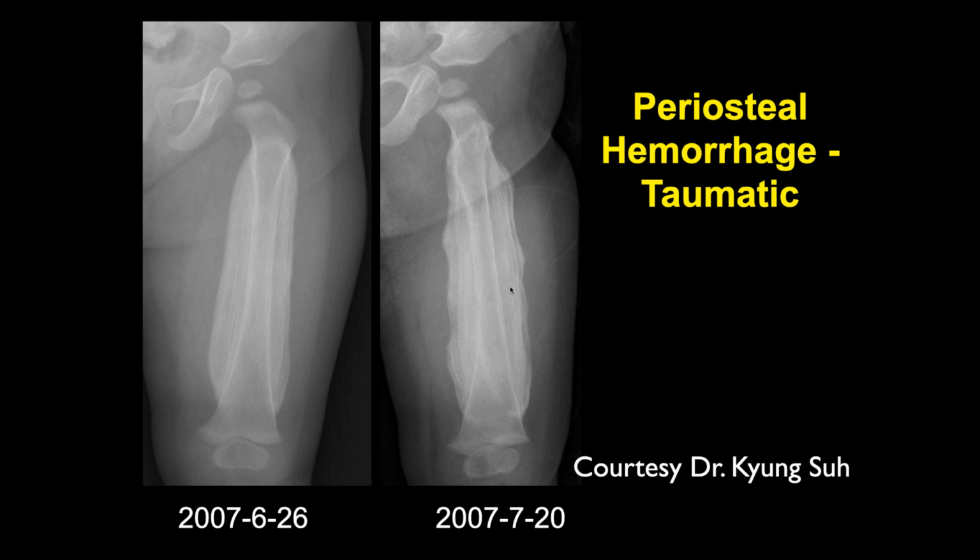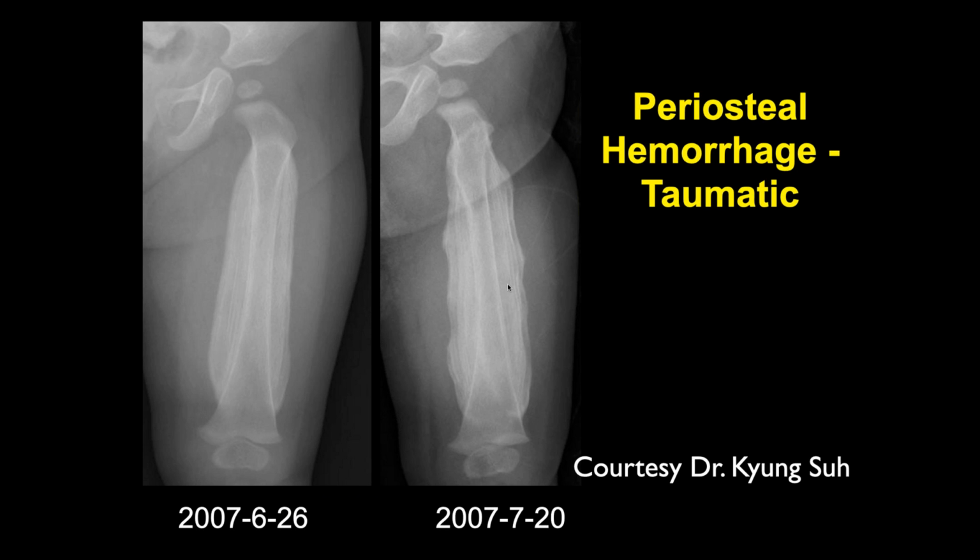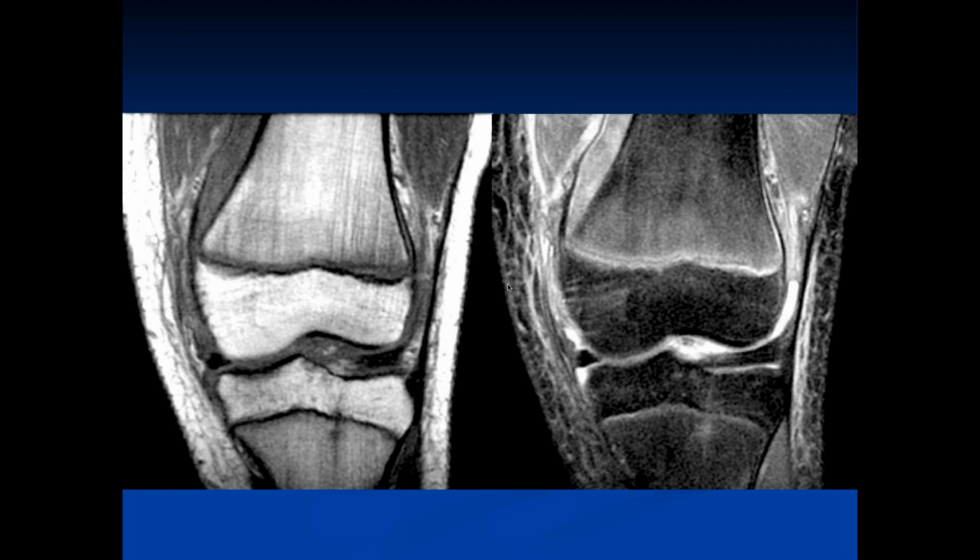I've seen this case before, but I missed the stomach on this case. Can you go back one slide, John? Look at that stomach. You think there's enough air in there? They just cry and they swallow air. My God.